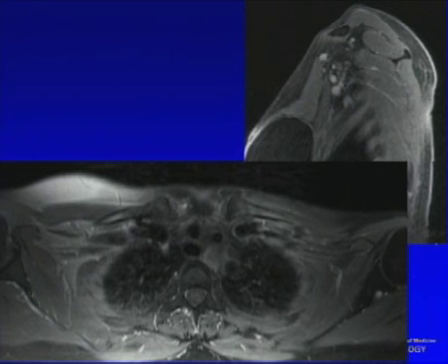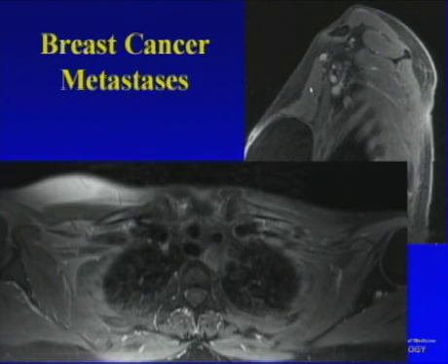Well, Monday morning, I get multiple phone calls from the patient, from her internist, from her surgeon, saying that the patient never had radiation therapy. So this is presumed breast cancer metastasis. So again, here's a case where if you look at some of the rules, looking for diffuse thickening, didn't necessarily follow. There was no enhancement. It's not really hyperintense signal. And with the history of the patient obviously never having had radiation therapy, it would be really hard to say that this was from radiation type of changes.